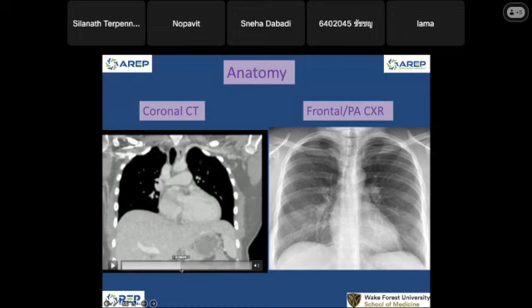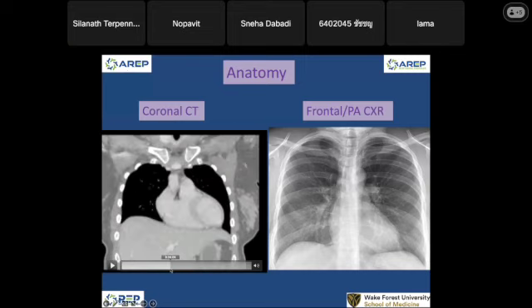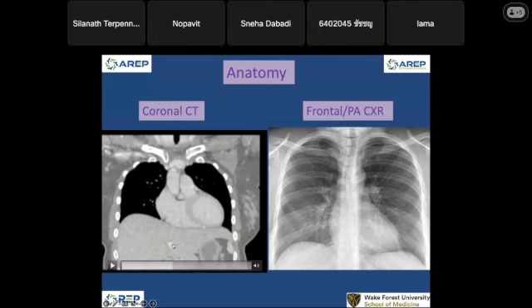Okay, and let's look at the belly a little bit. So this is your liver. This person has a very well expanded liver. Normally, sometimes the left lobe stops here, right below the heart. Sometimes it crosses the midline and covers the spleen, like this one is covering the spleen. Okay, this is the portal vein in the liver.